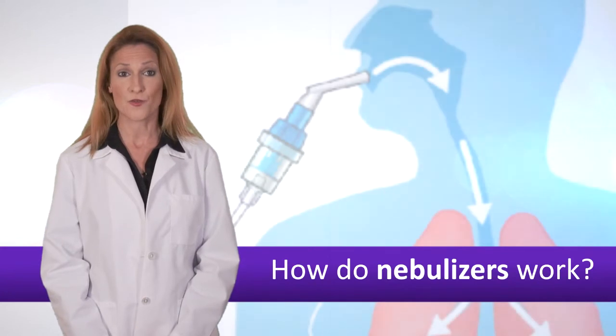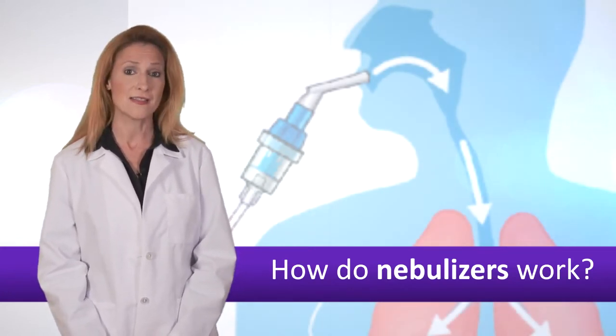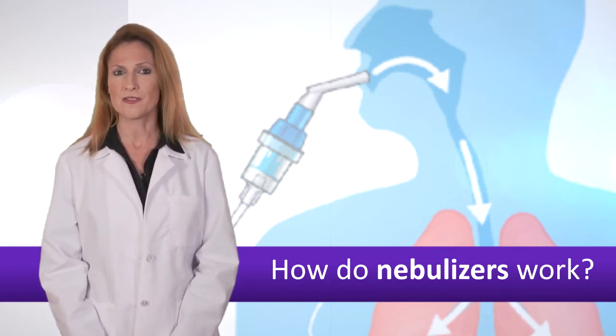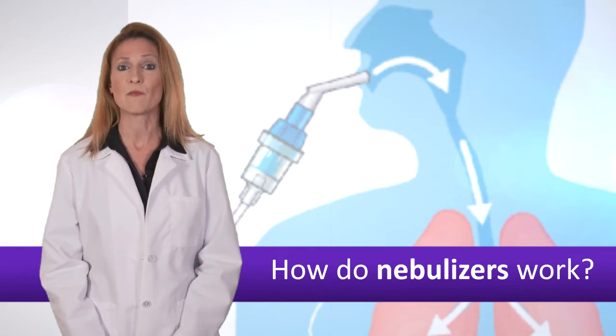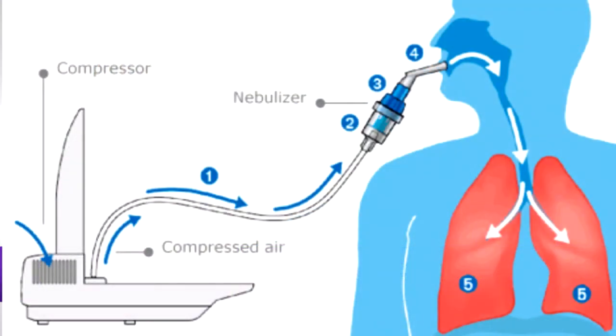So, how do nebulizers work? In the nebulization process, the liquid medicine is aerosolized into a fine mist. The goal is to form small liquid droplets that are the right size to be inhaled and remain in the lungs, about 3 to 5 microns. The compressor forces air through the liquid medicine through a narrow opening at the bottom of the cup. Air turbulence forms the medication mist.